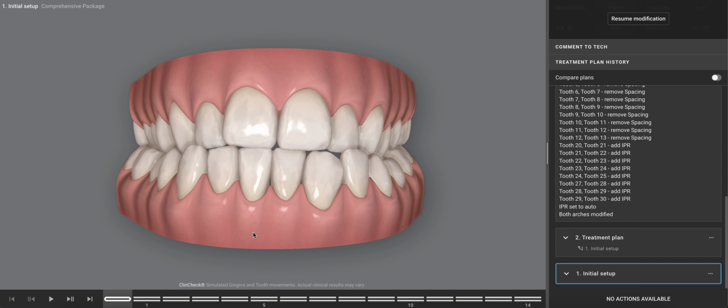So our job is not to perfect every patient and then turn away patients that aren't interested in perfection. Our job is to listen to what the patient's needs and desires are, and then educate them on what the pros and the cons of each treatment plan are. And that's definitely relevant here. So what I would say is, if the patient's primary concern here is aesthetics, we can definitely do something here, but it's going to be challenging.